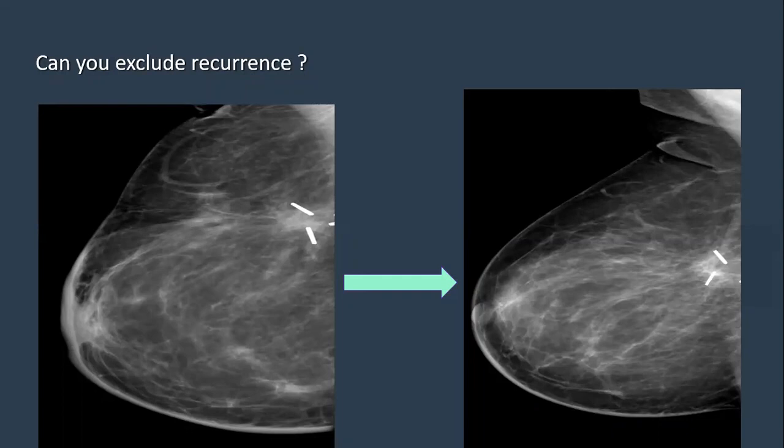According to the type of calcification itself, is it suspicious or benign? I told you, you have a large ball of coarse calcifications. Large ball, you mean rim, or what do you mean? Dystrophic calcifications. A large piece of dense dystrophic calcification, a ball of dystrophic calcification at the site of surgery or surgical scar.